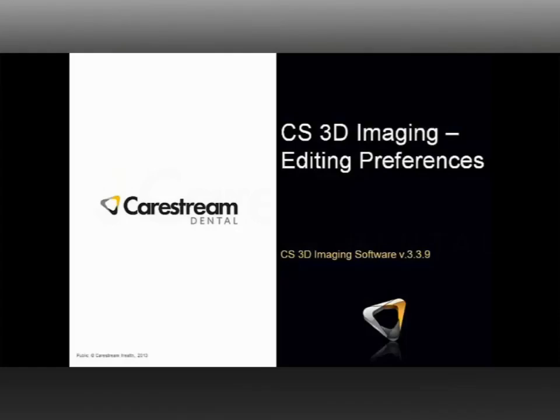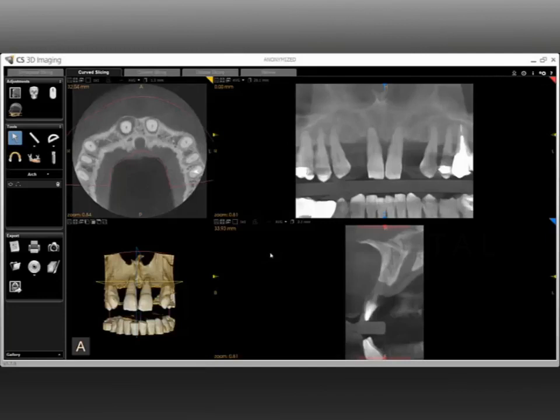In this lesson, we will learn about the preferences in CS 3D imaging. We will look at what they do, what's recommended, and how to edit the preferences to customize the program for yourself. The preferences discussed here are for version 3.3.9. If you're not on the current version, please go to carestreamdental.com to update.